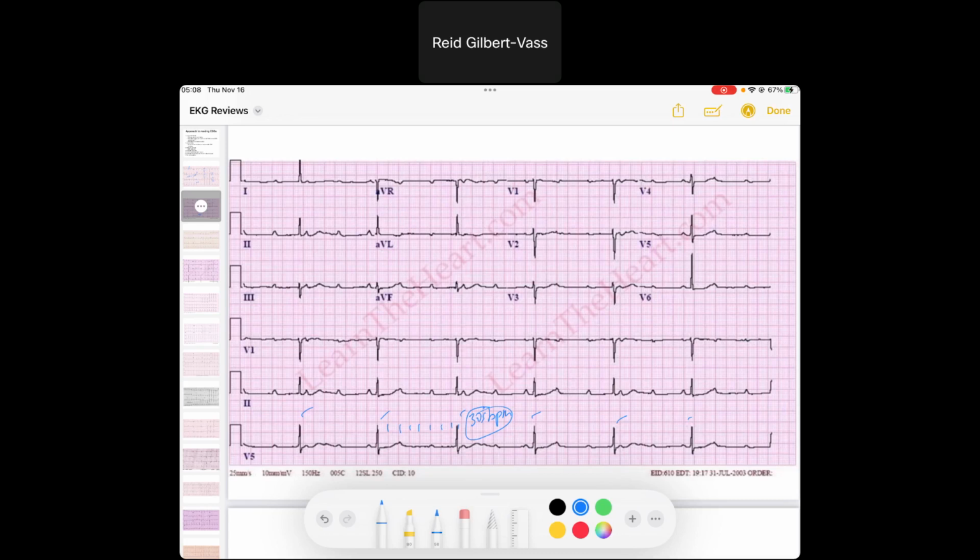So let's look at the atrial activity, and I start looking. I see this P wave, and I see some P waves. There are definitely some P waves that are not associated with QRSs. And if I look closely, and your eye will get better, you'll start seeing P waves that are buried in places that they shouldn't be. You can even see a P wave on top of that T wave.